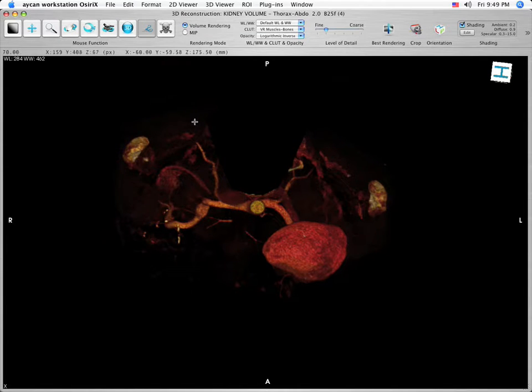A rendering message will briefly appear during the process. As a note, depressing the Enter or Return key allows the area inside the polygon to remain and cuts the structures outside the polygon. Another way to remember the function of the keys in relation to the area inside the closed polygon is Delete equals exclude the area and Return equals include the area.